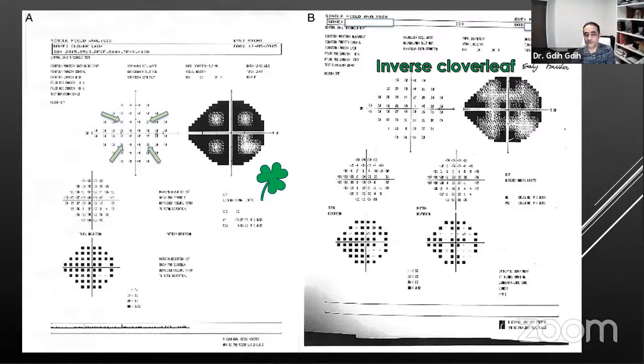They say you find 1 in 4,000 or 40,000 leaves. They're mostly 3 leaves, but when you find one with 4 leaves, you can make your wish. And I think that's more in Ireland. Anyway, this is the form, but it's not that uncommon in our Humphrey visual field world. You will see it a lot.